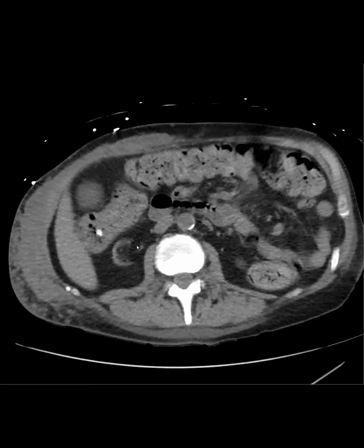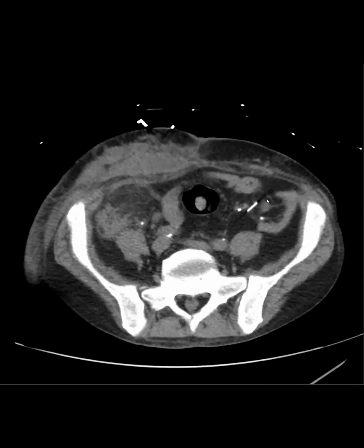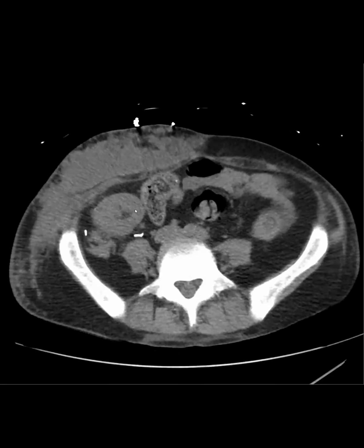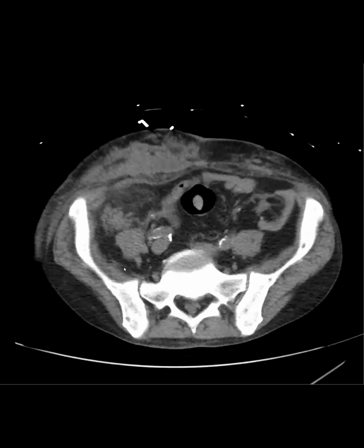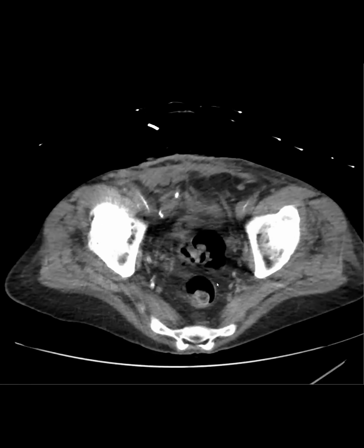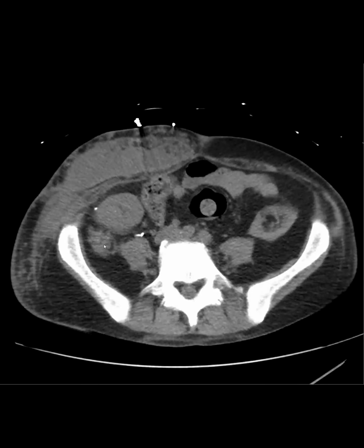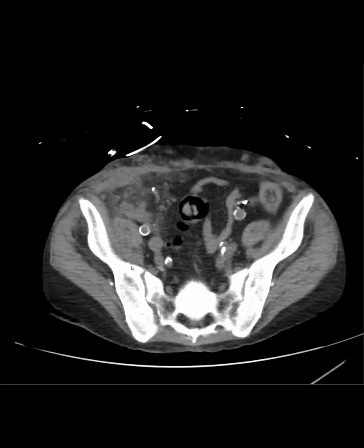They have chronic renal disease, really atrophic native kidneys. They have one failed left lower quadrant renal transplant. They have an additional right lower quadrant renal transplant. Anything else? There's a lot of soft tissue in the right lower quadrant, right there. This stuff? Yeah, what is that?